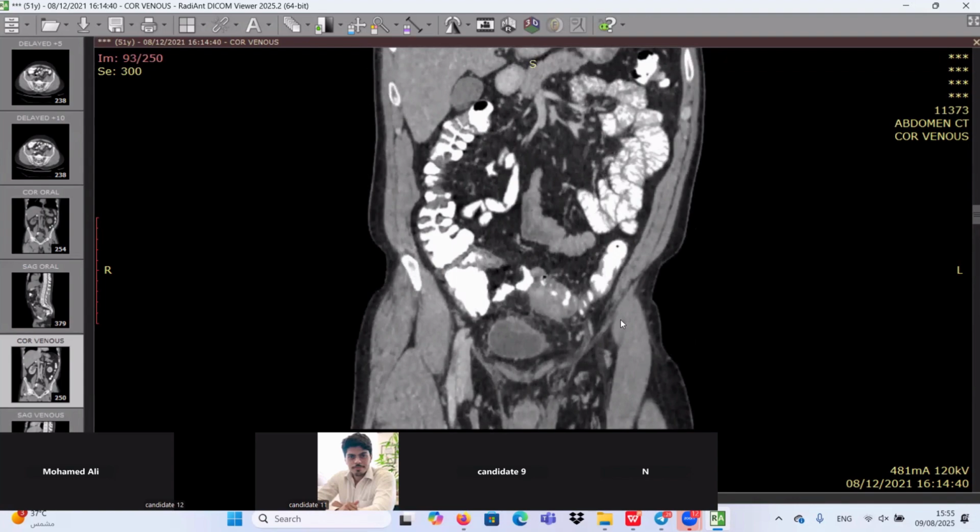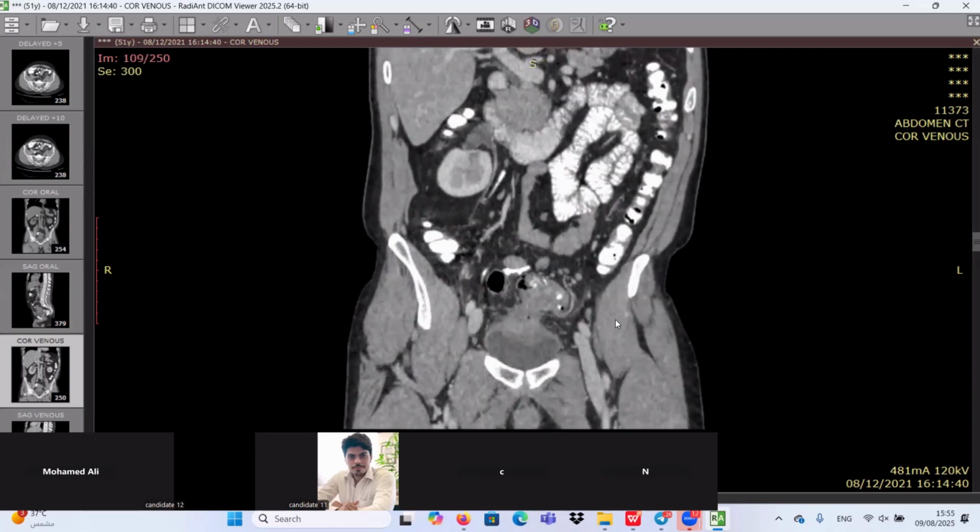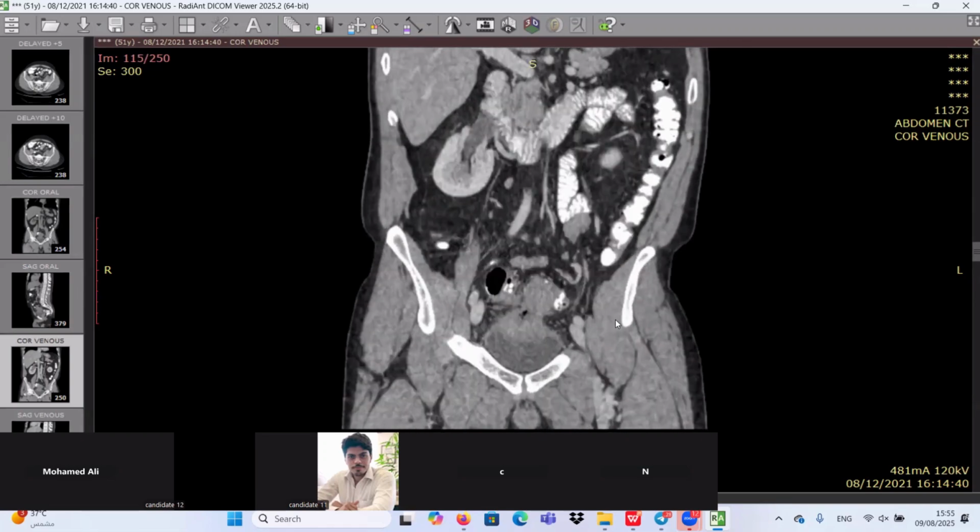Why is this one not colonic carcinoma? The long segment affection and the presence of diverticula, with no obvious stricturing or mucosal ulceration. Colonic carcinoma would be a short segment involvement. It would have an irregular stricturing and an irregular mucosal lining that cause an apple core appearance, and would cause an upstream obstruction of the proximal bowel loops. But here it's a long segment and appears to be localized.